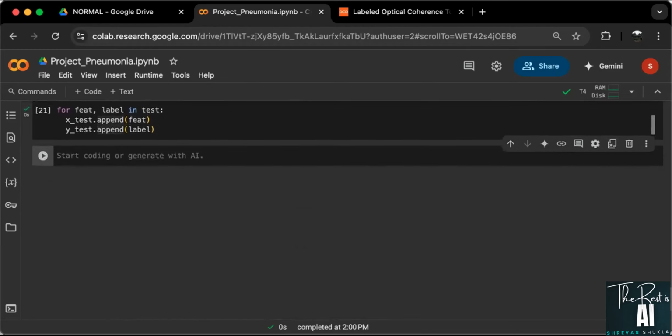Now what we have to do is perform a grayscale normalization to reduce the effect of illumination differences, because we need to pre-process them to ensure they are in the right format, and to enhance the model's ability to learn, we will put all of them on the same scale. Each image is resized to 150 by 150 pixels and converted to grayscale. But for a CNN to work, it is beneficial to normalize those pixel values.